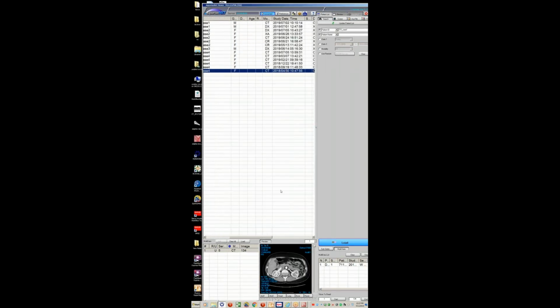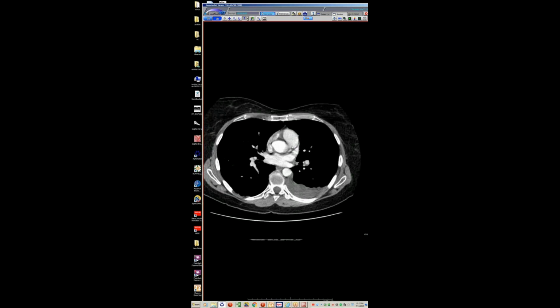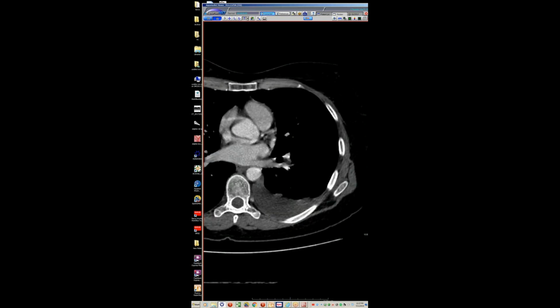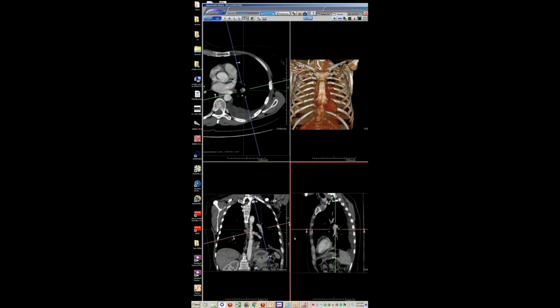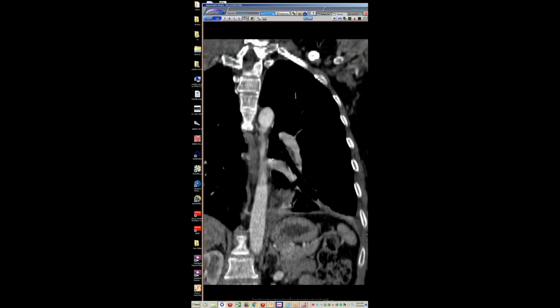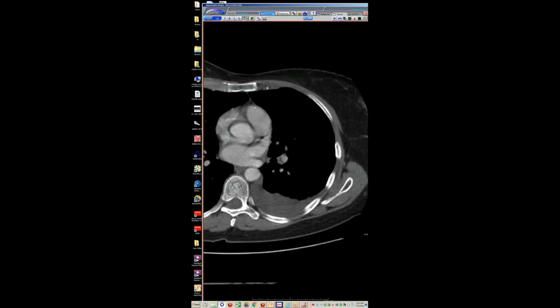And I don't remember. Oh, this is just a really scary case because, and I can't remember if I showed this before or not, but it's worth repeating if I hadn't. So here is a patient who comes in with a little bit of chest pain and has this in her left lower lobe PA. And I think this is not a PE study. This is from an outside institution. And you can see that there's just this layering soft tissue here. The vessel distal to that is gone.